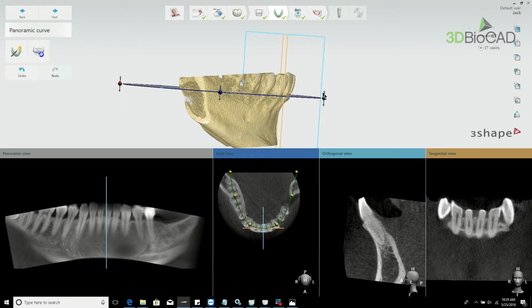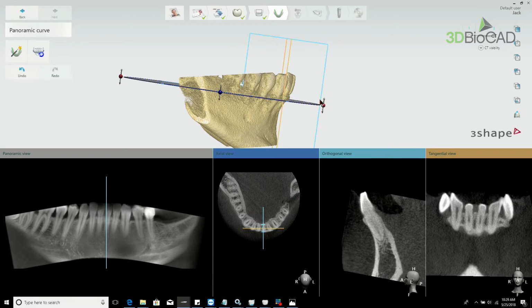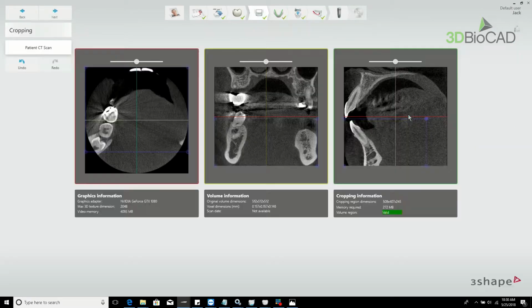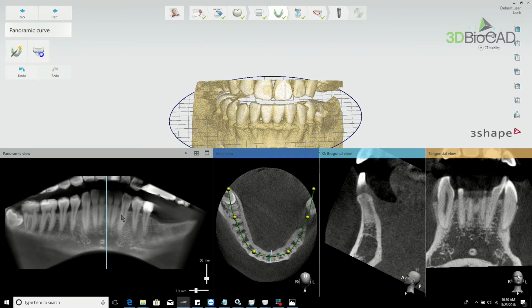This is really important because if the angle goes down too much like that, if you see the CT, oh, and then also I cropped too much, right? Let me just go back. Bring up, go back. So anytime we can go back and forth. This is not really a good angle.